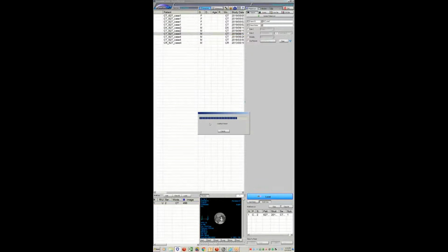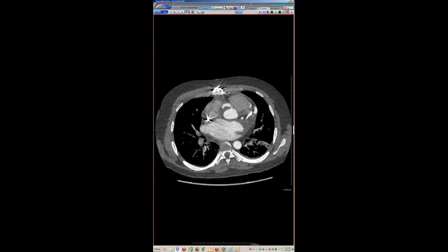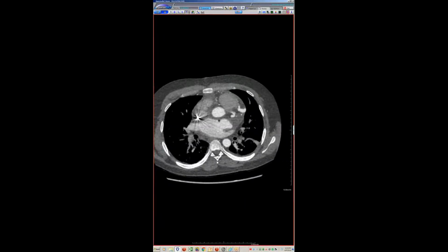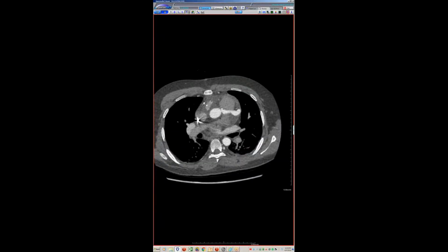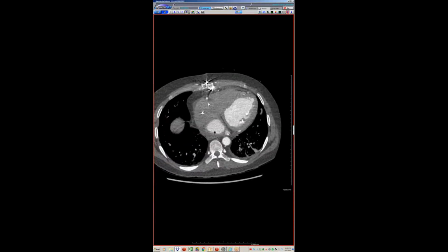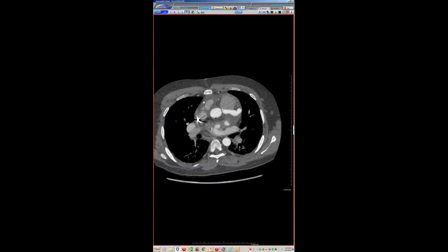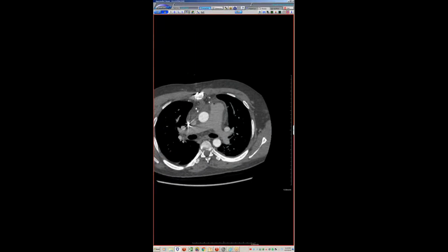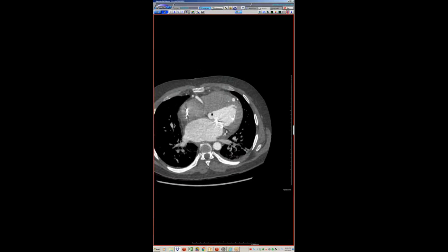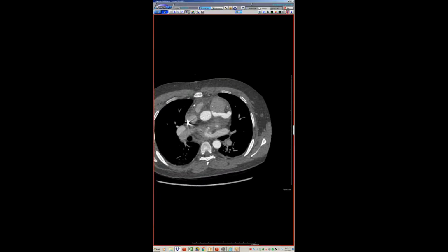Check that out. And what is this case? Oh, this was a new one to me. So a couple of months ago, I showed a case of a young kid who came in with ALCAPA, who, sadly enough, had gone through multiple interventions, not coronary interventions, but interventions for AFib. And then on a pre-planning AFib CT, we saw that the patient had ALCAPA.